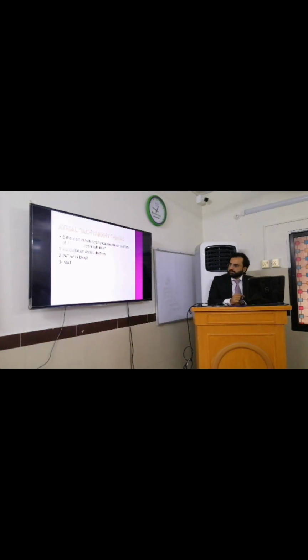As you know, this tachyarrhythmia is further divided into accelerated atrial rhythm, PAT with block, which is paroxysmal atrial tachycardia with block, and MAT, which is multifocal atrial tachycardia. Try to understand the concept. There are three varieties: one is the accelerated atrial rhythm, the second is PAT with block, and the third is MAT.